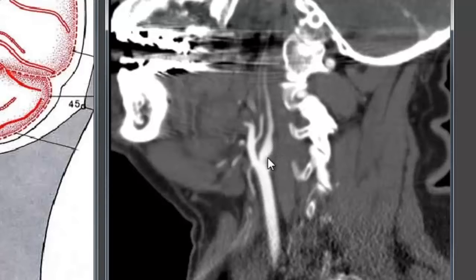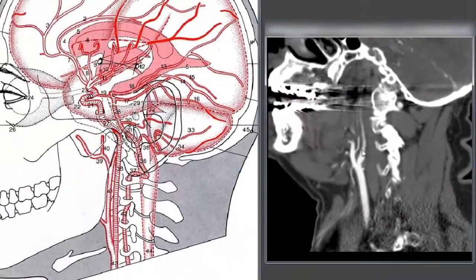There's no hard cutoff. It does not appear that there is an acute occlusion from a ruptured atherosclerotic plaque at the origin, but instead there is a clot downstream, in this case of the carotid terminus, that's preventing the egress of blood out to be able to allow contrast to fully opacify this artery. So it looks like there's a tapered narrowing to the vessel, but that's not actually the anatomy of the vessel. That's a functional consequence of the carotid terminus occlusion.